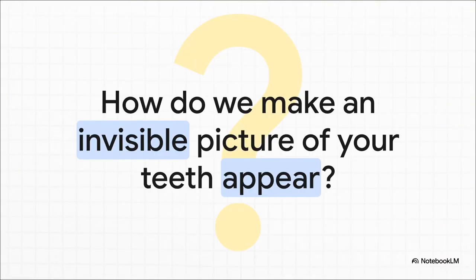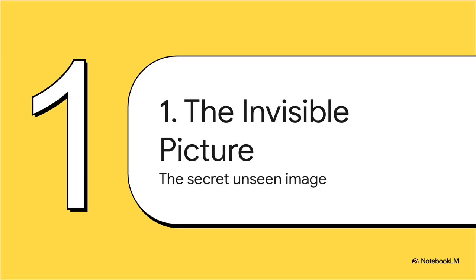And this is the central mystery. Before it ever touches a single chemical, that film is holding an invisible picture of your teeth, a secret message written entirely by X-rays. So how in the world do we go from what looks like a blank piece of plastic to a super detailed diagnostic image? Let's dive in.